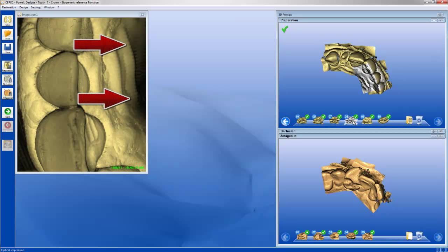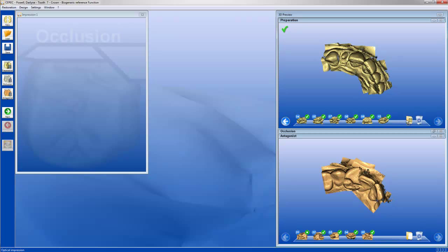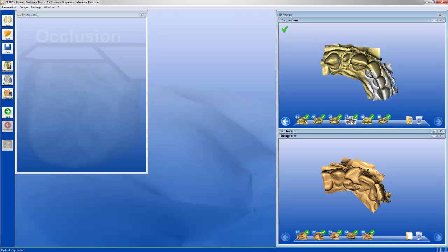So here's 8. Again, jagged. See the shaking? Let's get rid of that image. We're going to clean up this model a little bit. So I would go through on every single case and I would attempt to get rid of any images that are just not good. So I got rid of a couple of them.